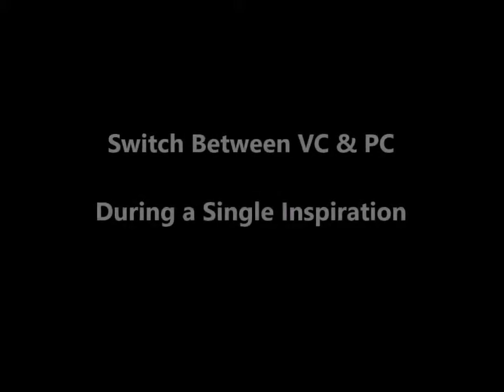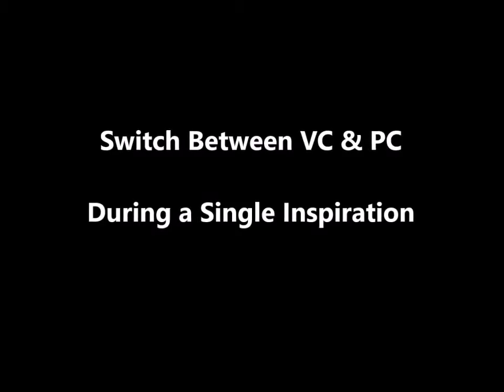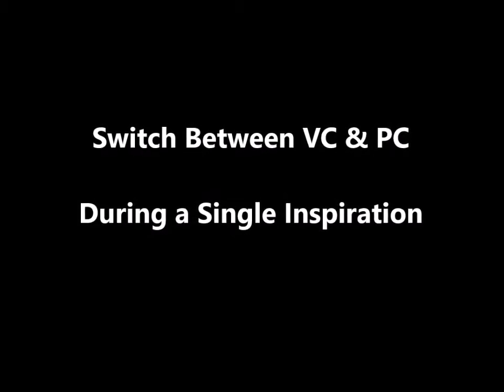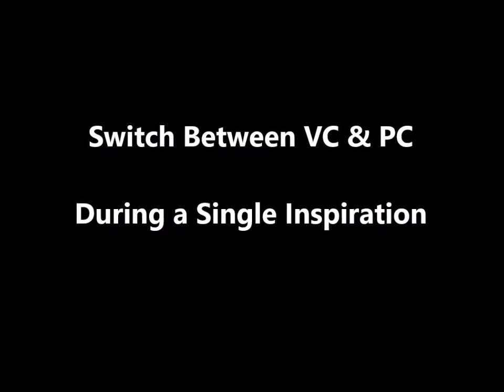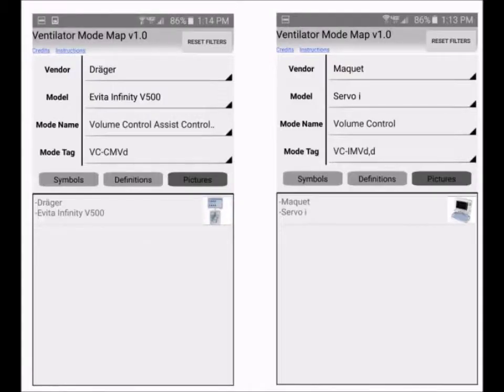A dual targeting scheme allows the ventilator to automatically switch between volume control and pressure control during a single inspiration. In this video, I'll provide two examples of modes that use dual targeting schemes.